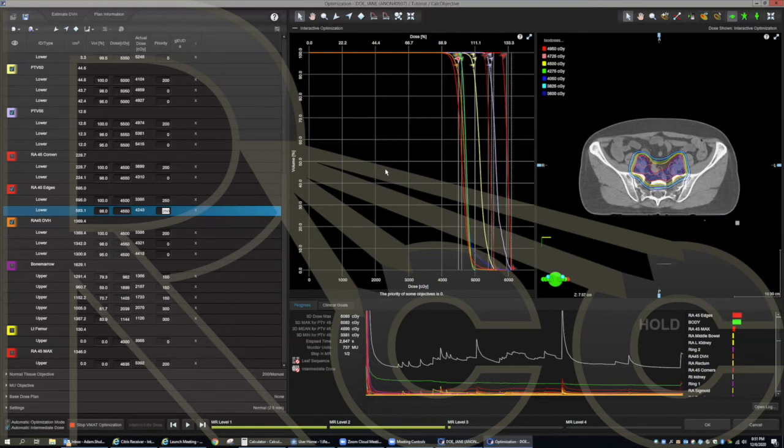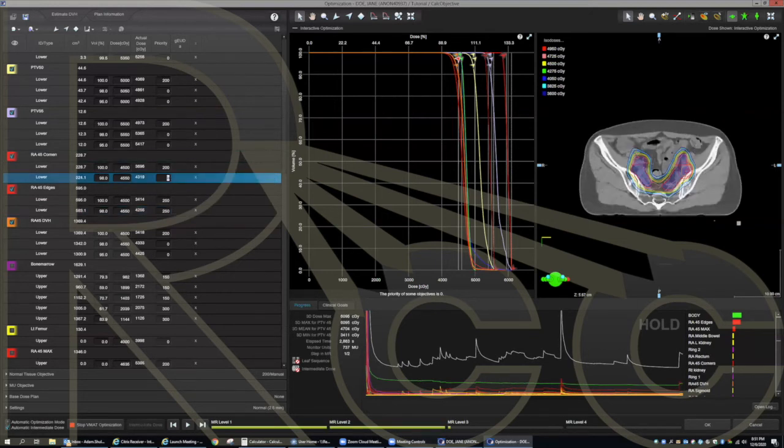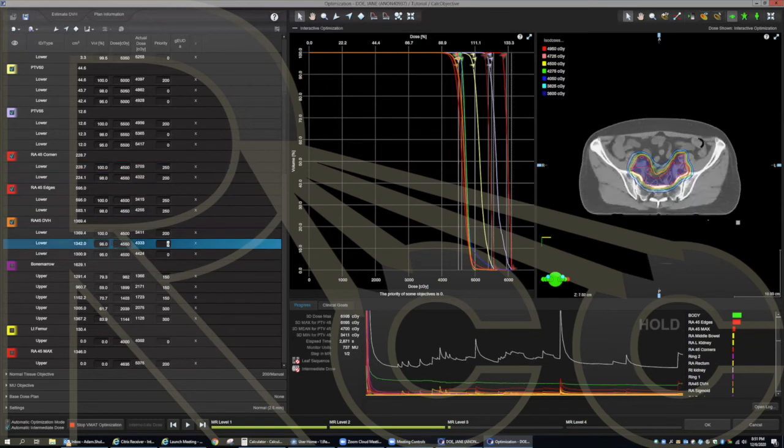So normally at this point, you will be using the edges, the corners, and the mats, correct? Yeah, typically my PTVs will go up to around 300 at this point. Yeah, the corners actually aren't bad. It did pretty well, but we can still push on it. And we can just push on all of them. So we never even use this 98%.